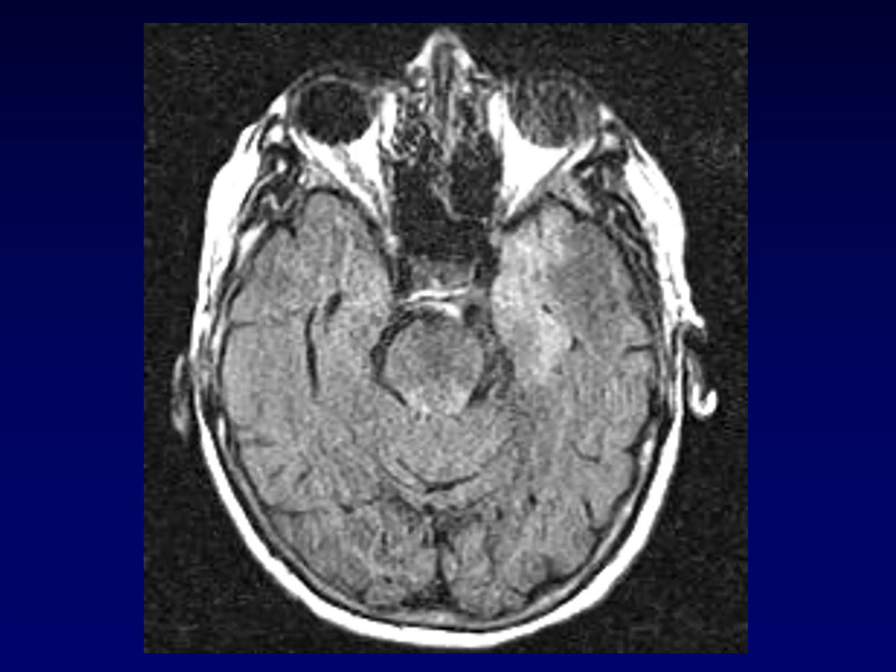Here's another type of infection. This type of infection is very particular about what part of the brain it affects. So I think the thing to notice on this FLAIR image is the asymmetry in the temporal lobes. You can see this temporal lobe is normal, but on this side, the medial part of the temporal lobe is abnormal. There's one particular infection that focuses on the medial aspect of the temporal lobe, and that's herpes. This is herpes simplex virus encephalitis.